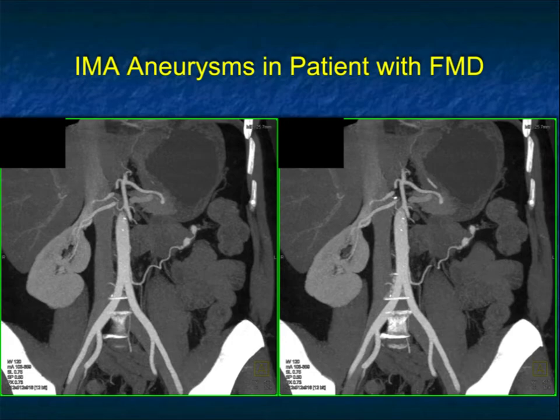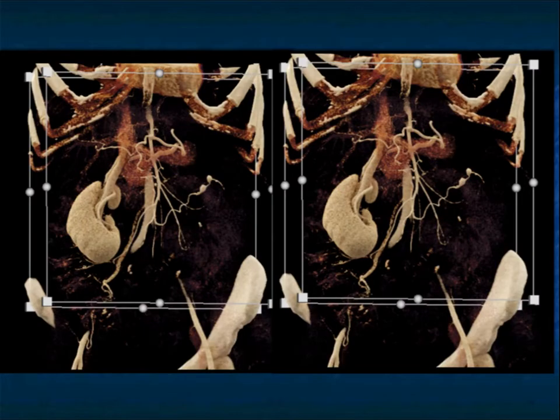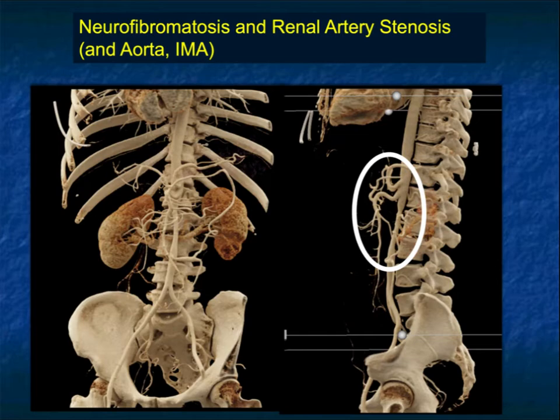So again, multiple organ systems, multiple vascular maps. Here it is with a cinematic rendering, needs to be looked at. So again, a comprehensive evaluation. Don't be fooled by seeing one aneurysm and stopping there. Again, when you're looking at vascular pathologies, the importance of really thinking about every organ and organ system becomes very important. You're more likely to see a second lesion than a patient who has no lesions, right? So you want to be very cognizant of that fact.